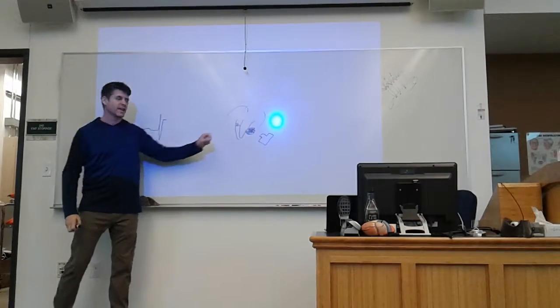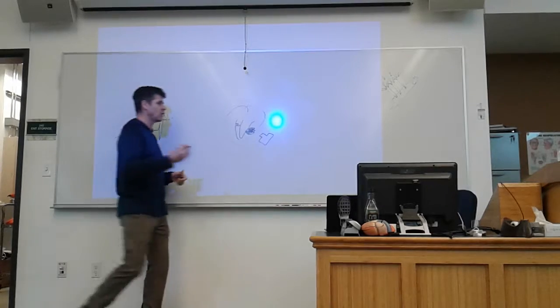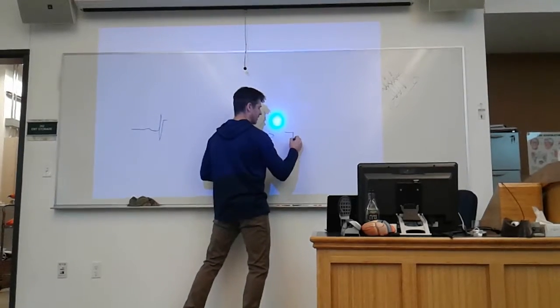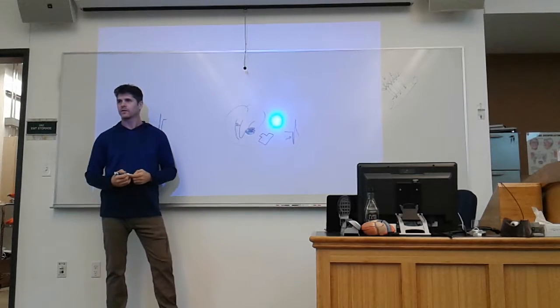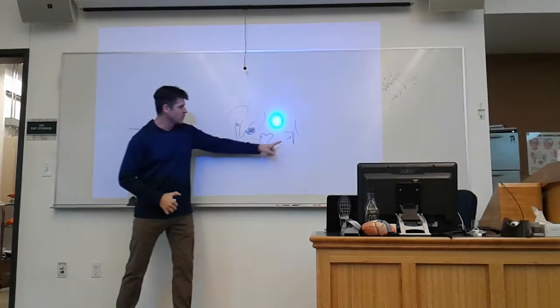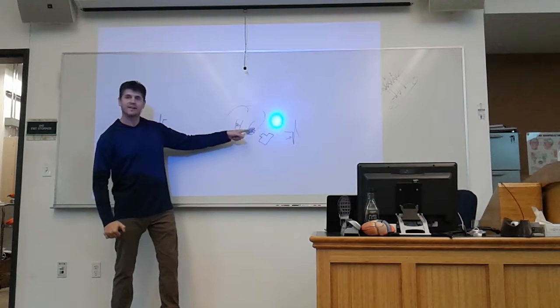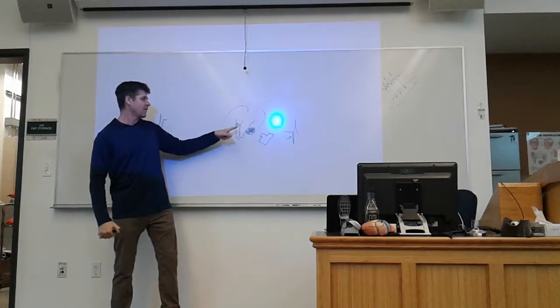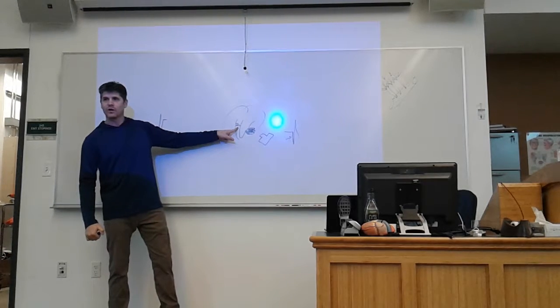Because nothing is going on electrically, we don't see anything in the ST changes. Instead, all we see is that Q wave. That Q wave that we didn't see before because it was hidden by everything that's going on here is now apparent in that particular lead because it's seeing this activity over here.